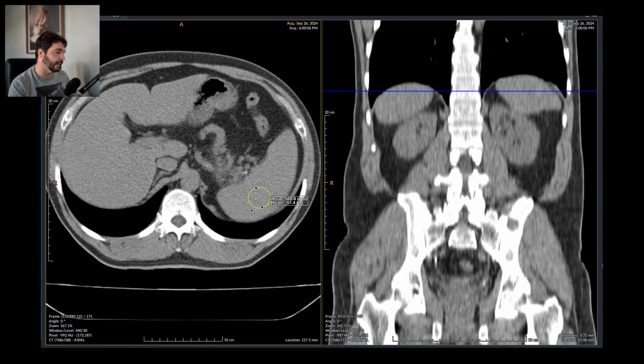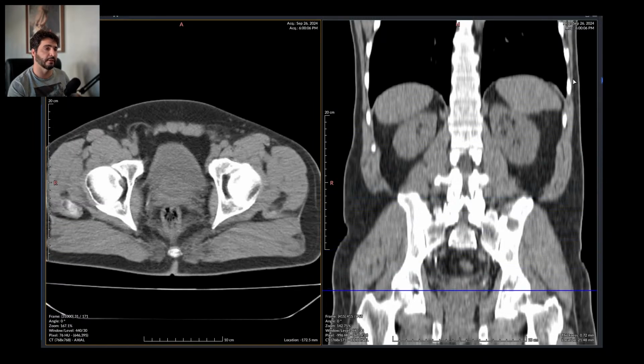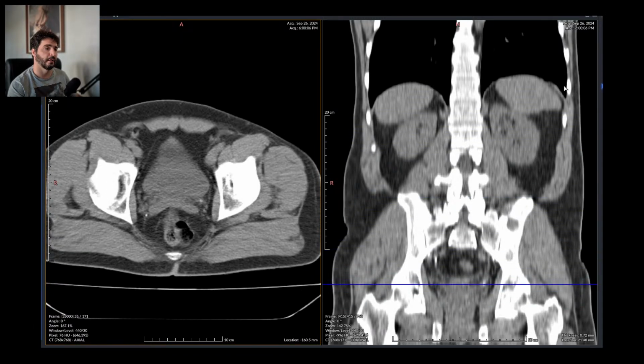So guys, I have to get to BJJ practice. My kids just got here and remind me of it. I'm just going to finish this scan. So this is steatosis and a left-sided ureter stone right there.